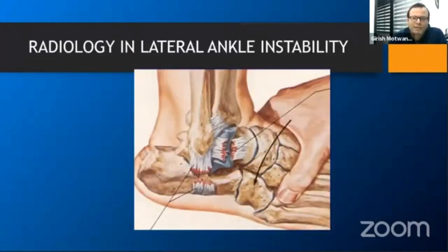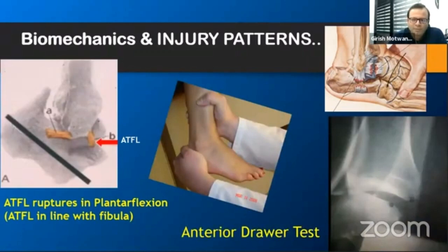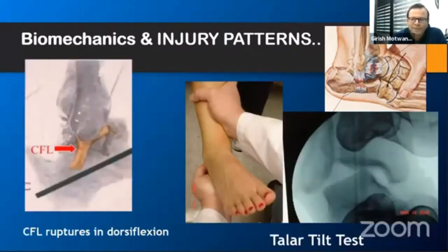Radiology in the foot and ankle, the ankle instability. We are all aware that sprain and chronic ankle instability is not an uncommon problem. So anterior drawer test, you have to give the thrust to the hind foot anteriorly, and you have to look for the anterior subluxation of the talus, if you're looking for the anterior talofibular ligament injury. The same thing for the calcaneofibular ligaments. It allows the talus to move into the mortise, goes into varus if it is broken.